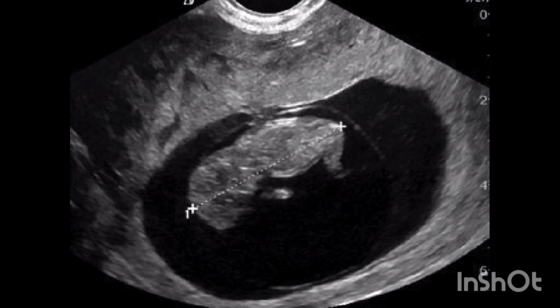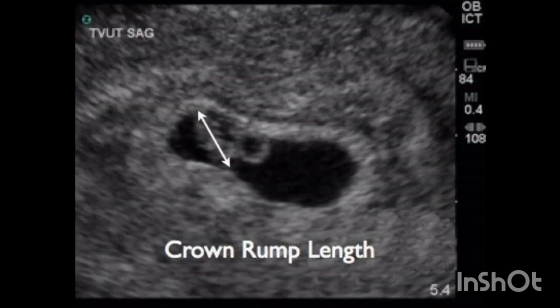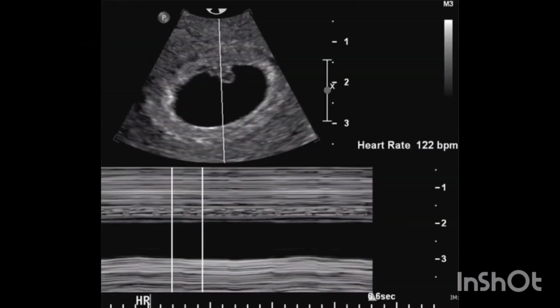Decreased crown rump length can also diagnose chromosomal anomalies like trisomy 18, which is Edwards syndrome, and other trisomies associated with growth restriction. Standard embryology texts indicate that the embryonic heart begins to beat at the beginning of the 6th week, when the crown rump length is 1 to 3 mm. Thus it is not surprising that cardiac activity may or may not be identified in normal embryos with crown rump length less than 2 mm.